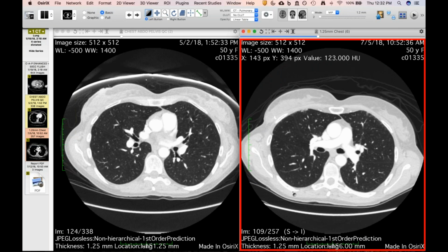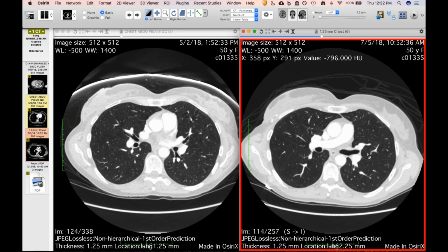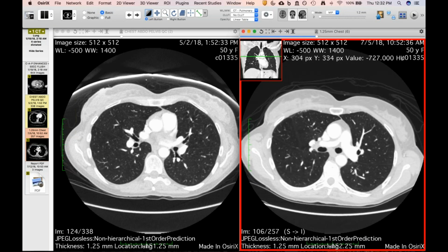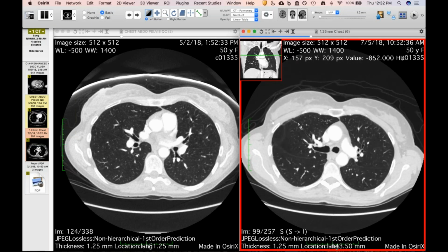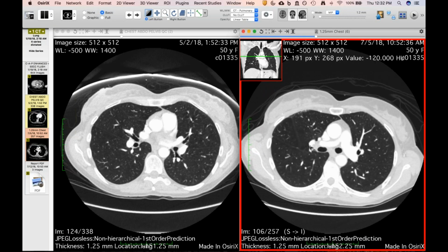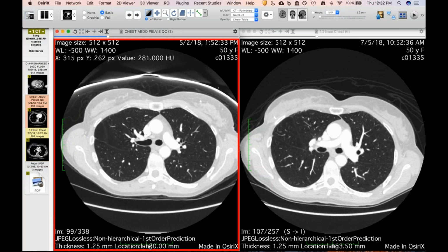Now, of course, we've seen cases of radiation-induced lung injury where the lung injury extends outside of the radiation field to other parts of the lung and can give you an organizing pneumonia type pattern. But it's interesting that it just seems to be almost recurrence in the field that was previously irradiated. And I don't know if anybody else has another thought or not.